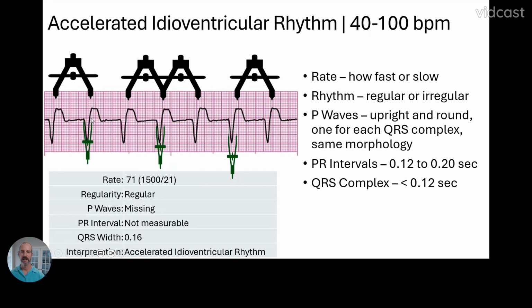I just wanted to point out the way that you measure the end. You have your change of direction up here. So your change of direction is occurring where this top caliper is pointing down there. Sometimes it's a little confusing, but that is essentially what we call a J point, where the QRS complex ends and the ST segment begins.